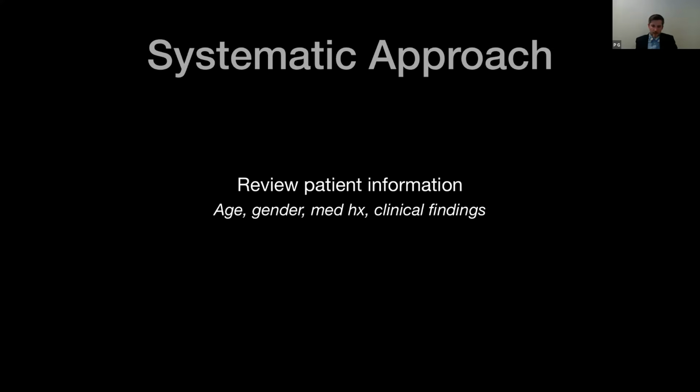In this way, you can correlate any clinical findings or their health histories with what you see in the cone beam scan. So this does help a lot. So you always want to correlate clinical findings with what you see in the cone beam scan.